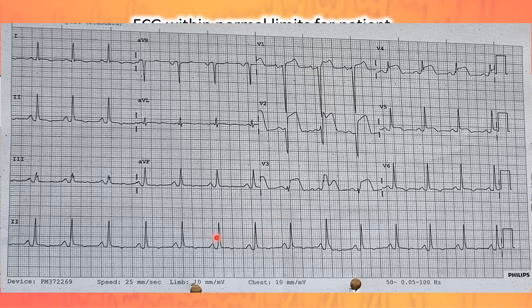Interestingly, in this ECG, there isn't any ST depression, and actually this patient had just spontaneously reperfused, and the ST depression had cleared up, but the ST elevation hadn't yet cleared. So important to differentiate ischemia from early repolarization.